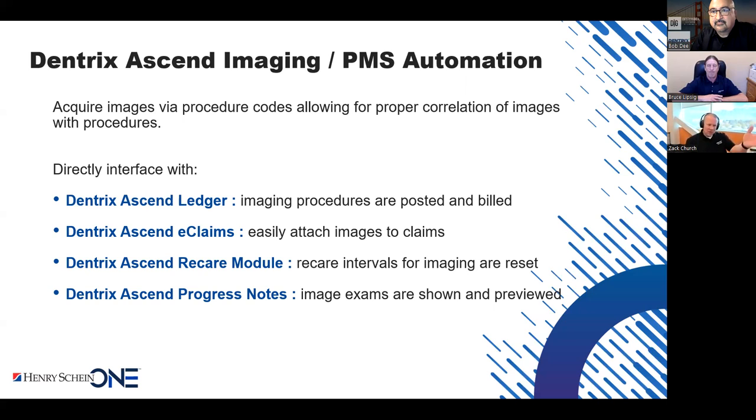And then you also mentioned ImagePeek in the chart. You select a couple of images or select a couple of teeth, and then you use ImagePeek to say, okay, this shows you the most recent image or images from those teeth. And so that provides a workflow for you to easily access your images.